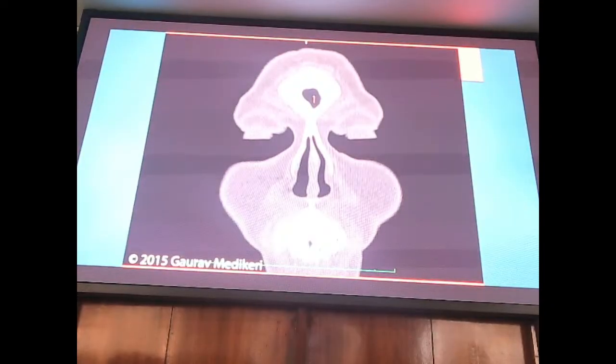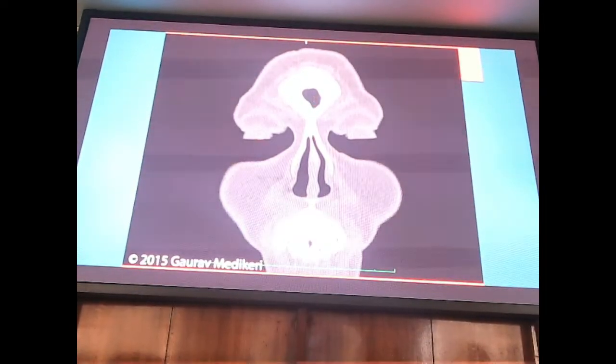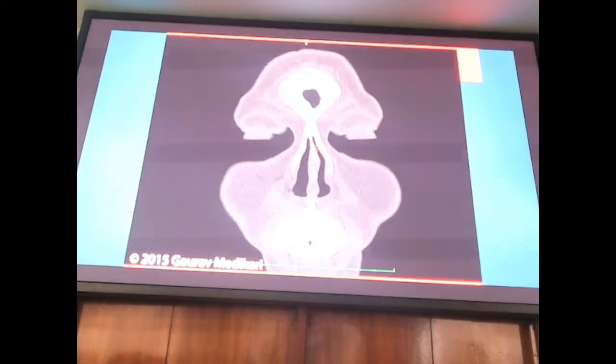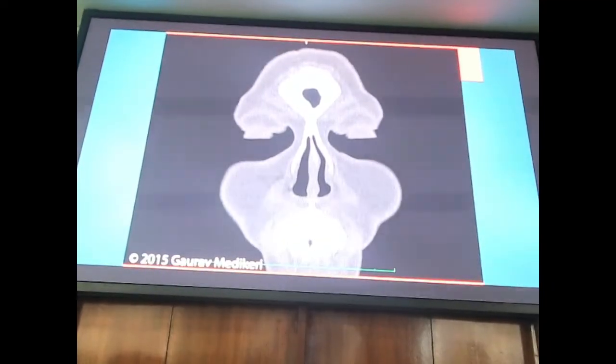So in the next part, if you go, you start to see the anterior table of the frontal sinus with the appearance of a single frontal sinus, which we are able to see. You can see the levator palpebrae superioris muscle there. You can see the frontonasal beak or the nasion, what we call, has started to appear. Number 4 is nasal bone. Number 5 is the perpendicular plate. You can start to see the cartilaginous septum, that is the anterior nasal spine, and the premaxilla.